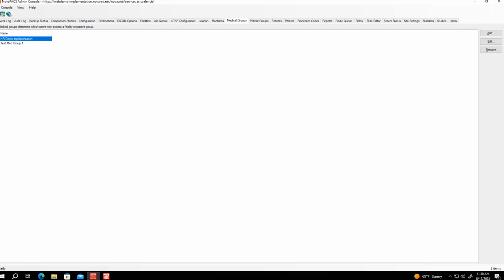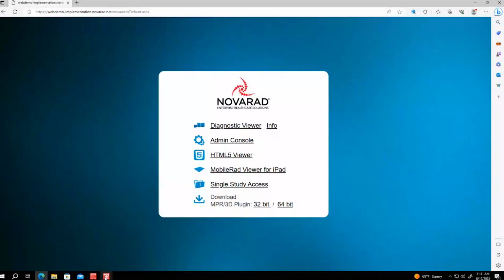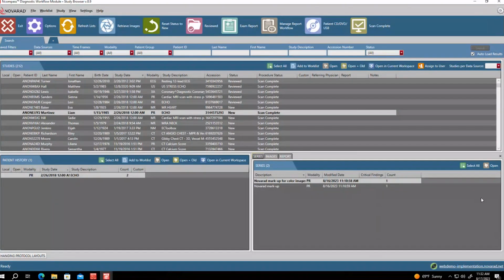So if there are no other questions coming in, I guess I will just jump directly into the viewer. Give me just a second to get that pulled up for us. Okay, so you guys all should be pretty familiar with our diagnostic viewer, but I'm going to go over some of the customization features that we have and just go through some of our basics. We do have a complete class on viewer customization that you guys can attend, but we're just going to go over some high level stuff really quick.